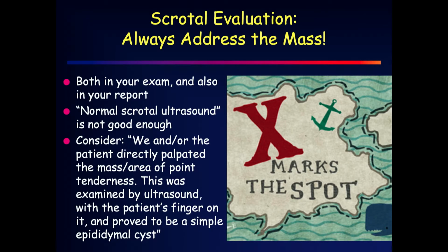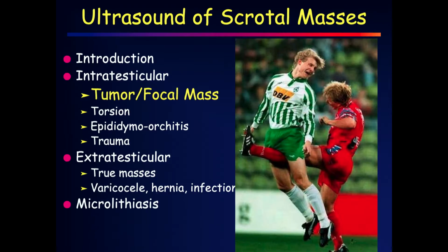One minor point here, please in your reports always address the mass. We get a lot of complaints from our referring docs where the patient palpates a mass, and we say it's a normal ultrasound, and they want something from us. We palpated the mass, the patient palpated the mass, we put the probe there, we looked where everybody felt the bump, and it turned out to be an epididymal cyst. So just address the mass in your reports.